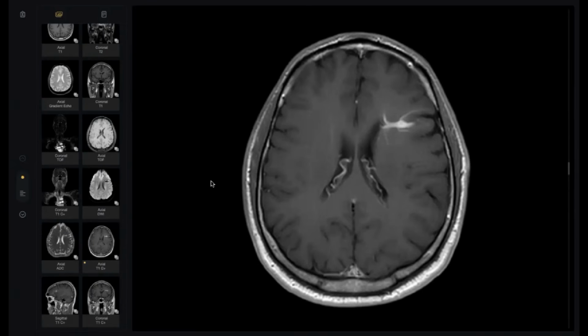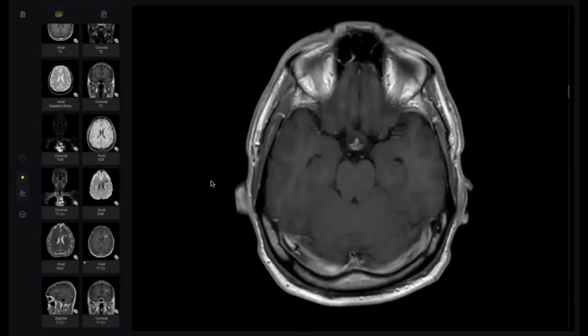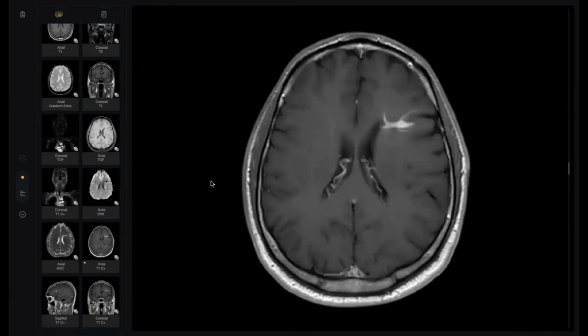What is the name of this sign, doctor? Sir, I don't know the name of this sign. What is the most common association with DVA? Sir, there's a common association with cavernoma, sir.